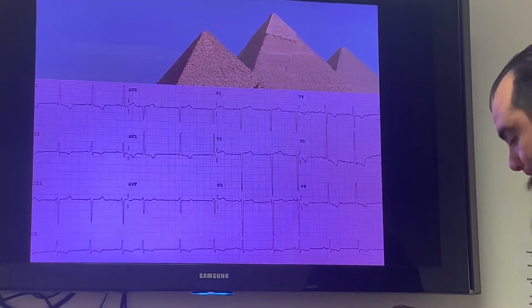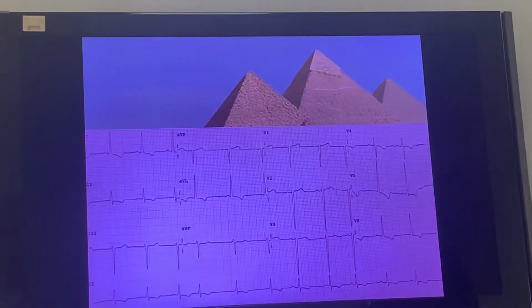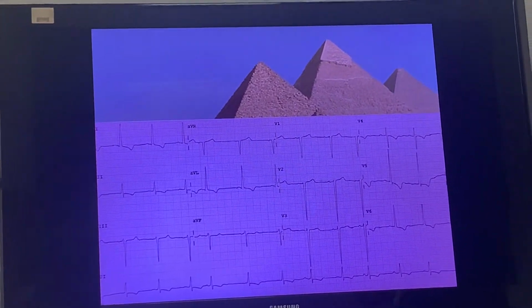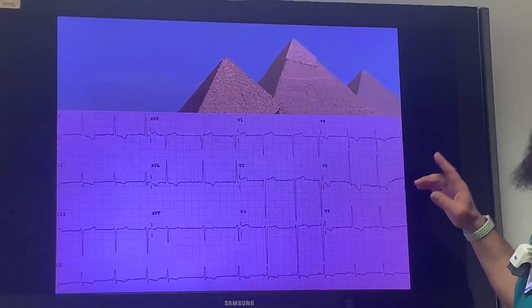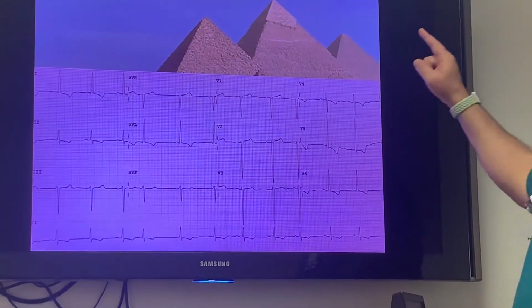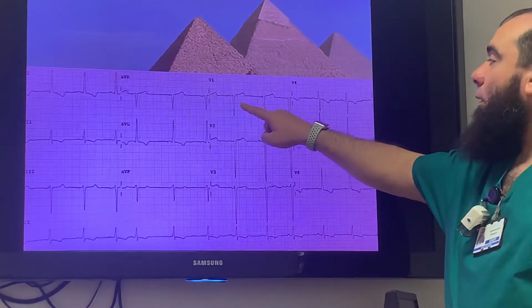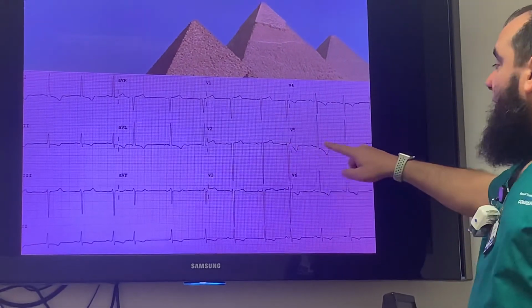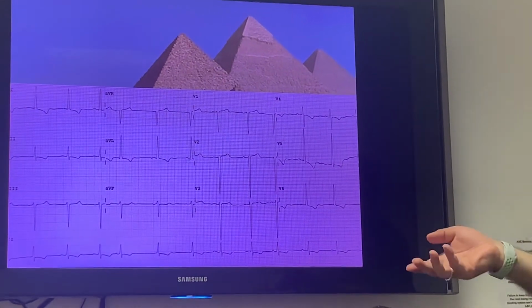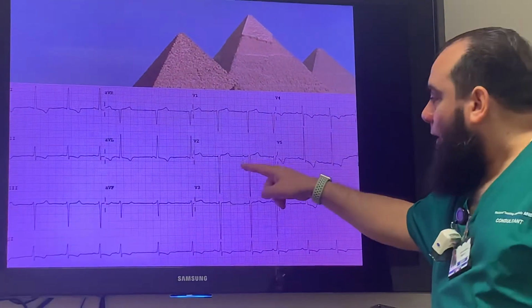Also, voltage criteria would also show left ventricular hypertrophy here, isn't it? I have covered it before, but let me discuss it. Lots of criteria have been discussed, but I will just start with a simple one. V1 or V2 S wave plus V5 or V6 R wave more than 35 small squares, or 7 big squares. So if you can define here, you can count here.